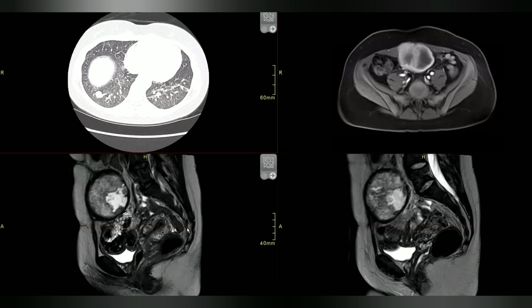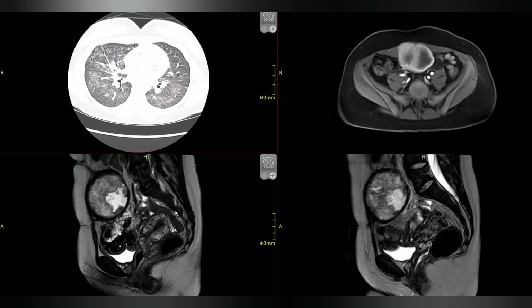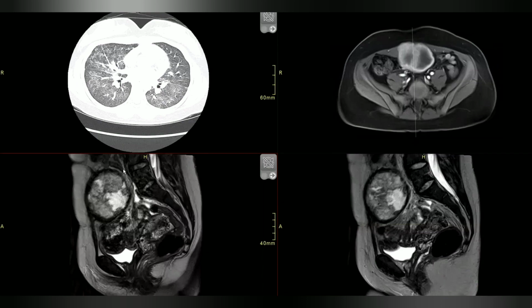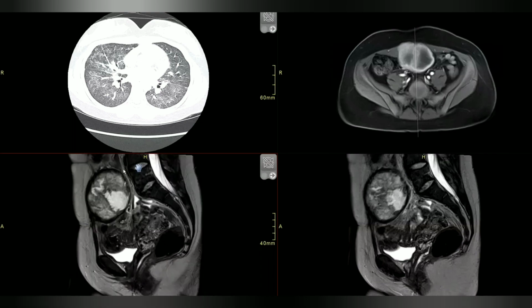So this is actually a choriocarcinoma case, but very interesting. When we did two ultrasounds for this patient, we did one ultrasound and she came with abdominal pain and it was reported as probable hematoma and the patient was signed off. She came back again and they did the second ultrasound and this thing had enlarged. Then they said we need to investigate further. Then she had MR, CT, everything. So this is a case of choriocarcinoma. I found this really very interesting, and it's outside the uterus. That's why I was so confused.